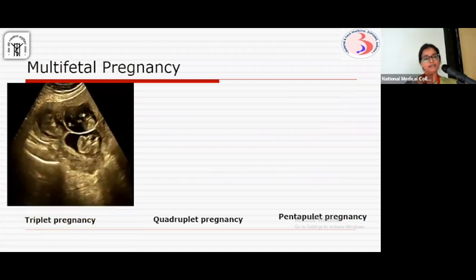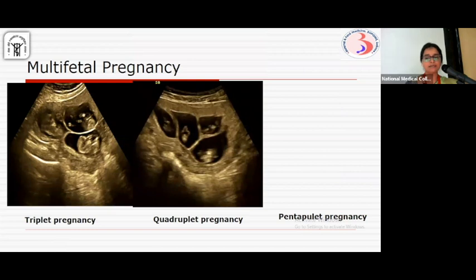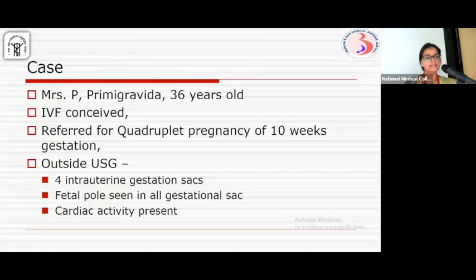Now the higher order pregnancies which we see in routine, like triplet pregnancy and quadruplet pregnancy. Then the next case is Mrs. P, primigravida, 36 years old, IVF conceived, referred to our department with quadruplet pregnancy.